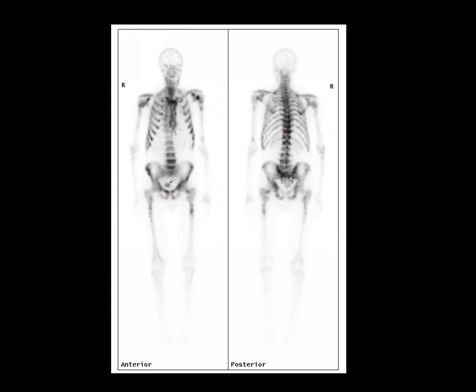You can also see there's relatively little activity in the bladder here. The technologist hasn't had to put a region of interest here to obscure the activity, and we're not seeing very much renal activity. Now, this is an appearance called a superscan.